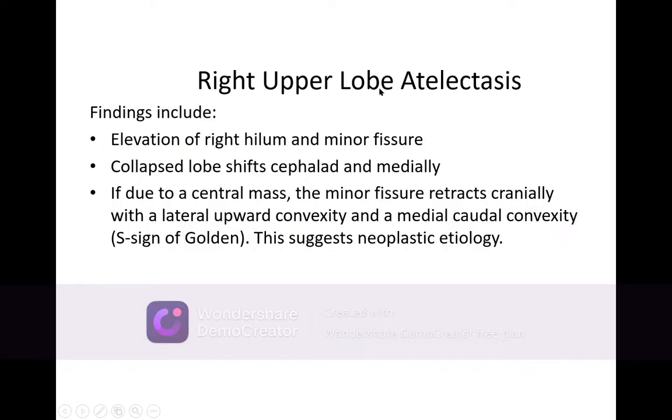The right upper lobe atelectasis findings include the elevation of the right hilum and the minor fissure, of course, and a collapsed lobe shifts cephalad and medially. Collapsed lobe will go up, definitely.